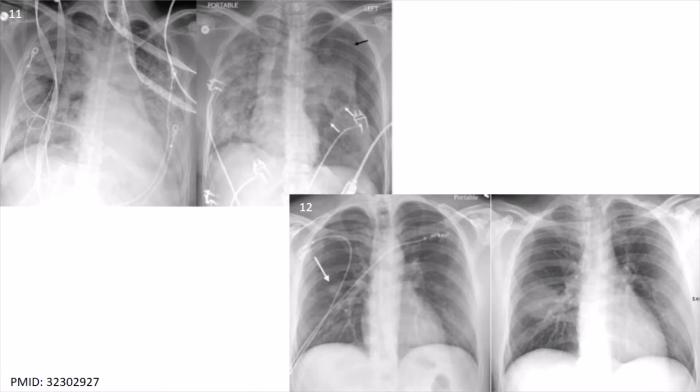In conclusion, patterns of COVID-19 lung disease can be identified on conventional chest radiography as well as chest CT. Typical verbiage when reporting patients with, or suspected of, COVID-19 on chest X-ray include terms such as irregular, patchy, hazy, reticular, and widespread ground glass opacities. Grading disease severity based on total lung involvement is also important to relay to the clinicians.